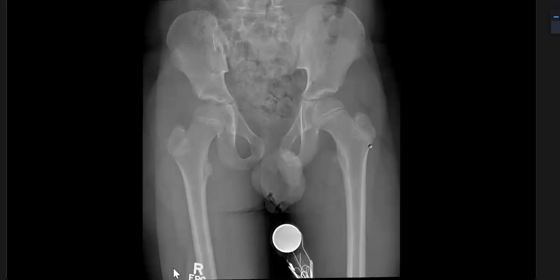I don't know why we're thinking about osteopenia here. These are bowel gas shadows overlying the vertebrae. This is all bowel gas. That means your eyes are not tuned to normal abdominal X-rays. X-ray is the weakest link. So you need to work hard on establishing normal versus abnormal. It is important. So there's no osteopenia.